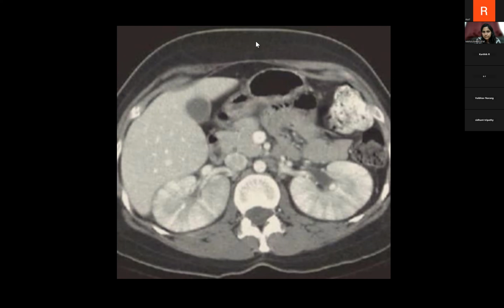Time is up. Okay, Anushri has answered it correctly first. This is striated nephrogram. Yeah, the answer can also be pyelonephritis, but pyelonephritis is one of the causes leading to the striated nephrogram. So here the right answer has to be striated nephrogram rather than pyelonephritis.